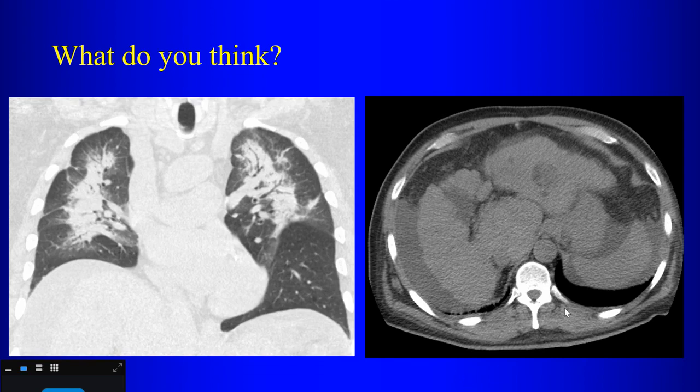First, what are the findings here? Cirrhotic, right, the liver. Ascites, right? In the left hepatic lobe, there's a mass. There's a mass there, yes. So how do we put these findings together? Metastasis. Do metastases give you consolidations with air bronchograms? Look at the location of these. Not quite perihilar, not quite at the periphery, right in the middle of the lung.